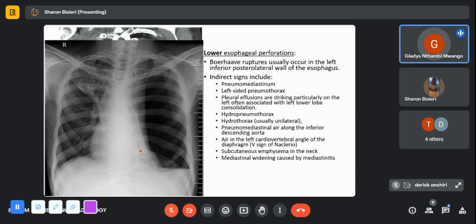Normally, I look at the heart and see how much of it is on both sides of the spine, because if there's rotation, I'd expect the heart to also rotate similarly. And just to follow up on that question, we've said here there's mediastinal shift to the right side.